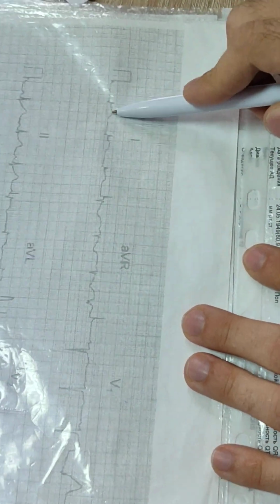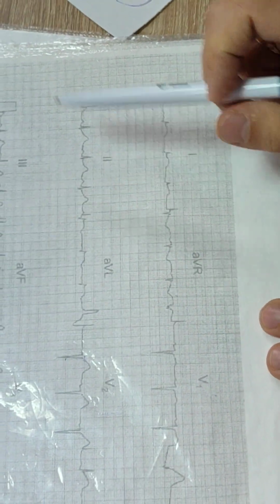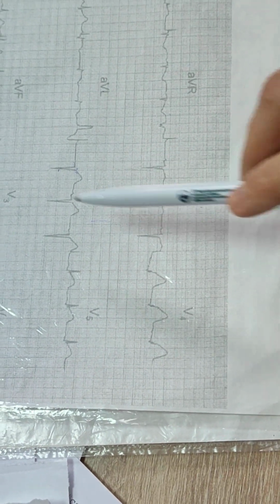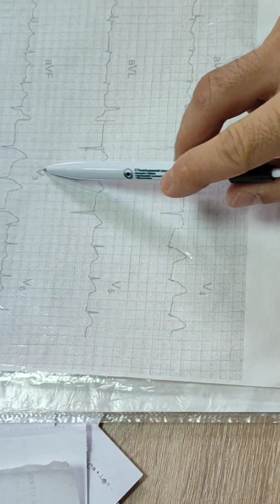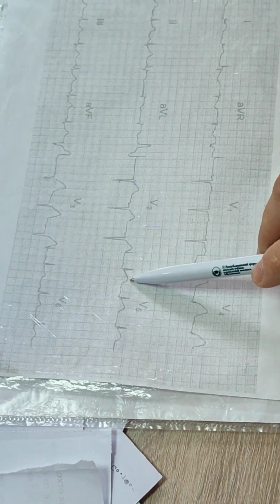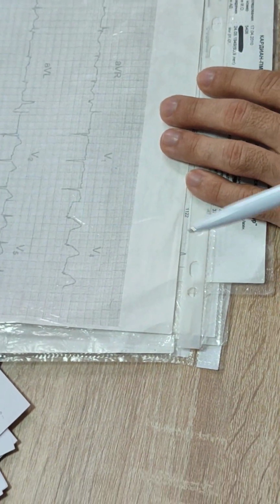First lead, elevated ST segment. Second lead, big T waves, bigger than 2/3 of R. AVL, elevated ST. V1, R wave, very small but present. V2, no R wave, QS, elevation of ST. V3, QS, elevation of ST, very big T waves. Then R, elevation of ST, and maybe big T. So V1, V2, V3, V4 are affected exactly.